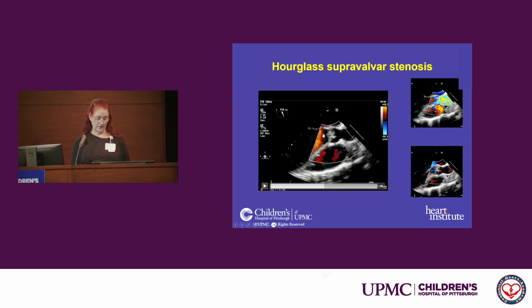And again, the coronaries are obviously involved. We cannot diagnose coronary ostial stenosis yet by 2D echo in the presence of supravalvular AS. Just always suspect it. And we can see whether Dr. Oliveira thinks we can do it by CT yet. We also still spend a lot on angiography for that and for surgeon inspection.